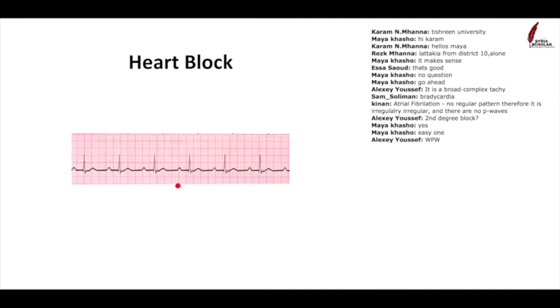So if we look at this example heart trace, you have your atrial depolarization and a big long gap before you have your QRS. It's more than 5 small squares. Take this one, this is a good example. That's the end of the 5 squares, and then 5 squares across you have a QRS. It should be less than 5, and this is a little bit more than 5. So this is what we call first degree heart block. It just means the fibers are working, they're conducting electricity, but they're doing so too slowly. This isn't something necessary to worry about. Lots of people have this when they get older. It just means that their conduction system's a bit slow.